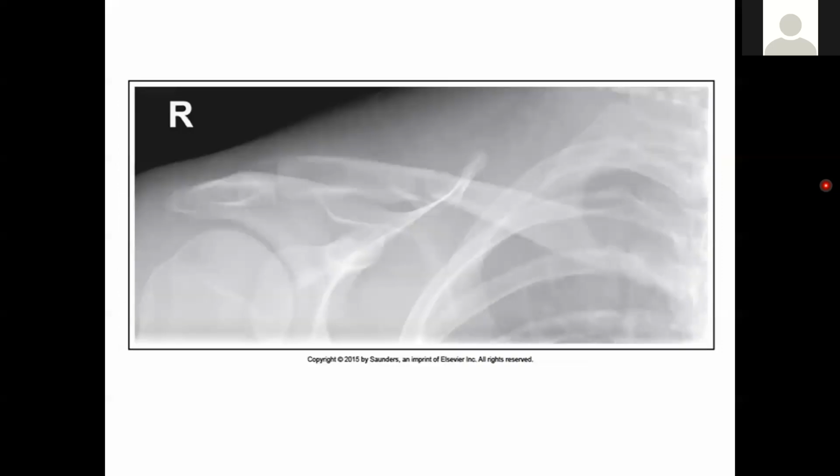Here's a right clavicle. Collimation is better on this shot. There is some pathology in here, fracture, AC joint, acromion, coracoid, superior angle projected quite a bit higher. Medial edge of the clavicle is visible. It's close, but we have all of it. So this type of collimation is ideal. This is not a shoulder series, so you don't need all of the humeral head. You don't need all of the patient's neck exposed.